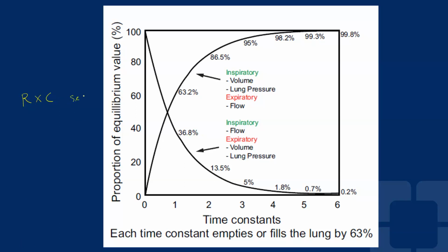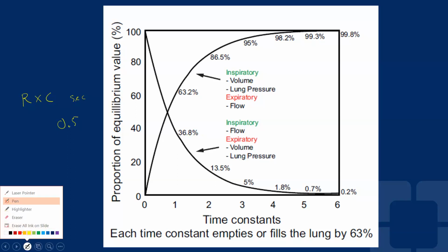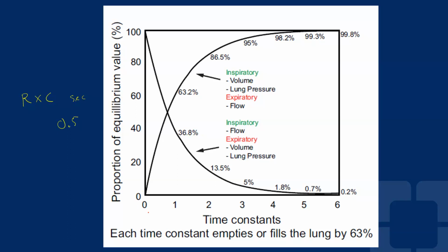And whenever the flow looks like a square or a triangle going down in a very geometric shape, this is suggestive that the patient is on volume control. The other reason is that you see all these oscillations on the expiratory flow, but you don't see them during inspiration, which makes you suspect that this is volume control. And then the waveform is also characteristic for that.